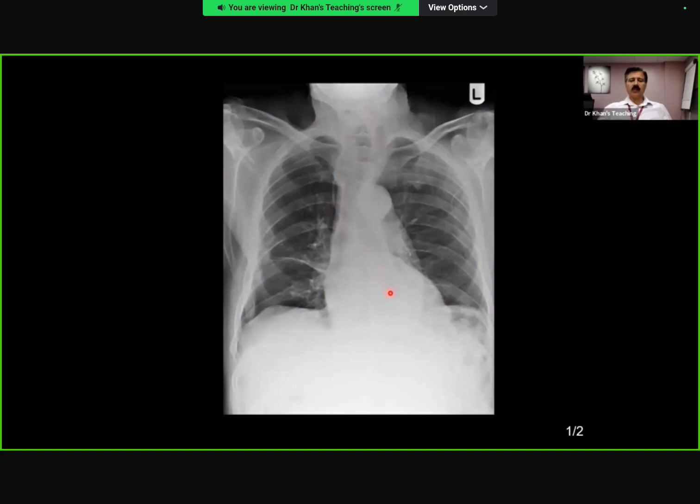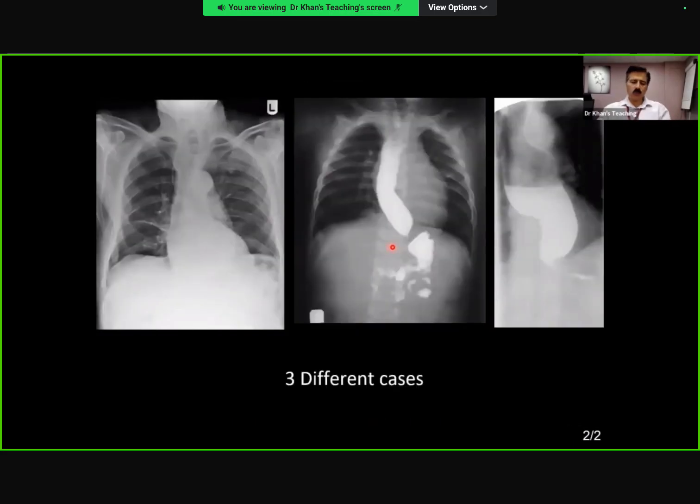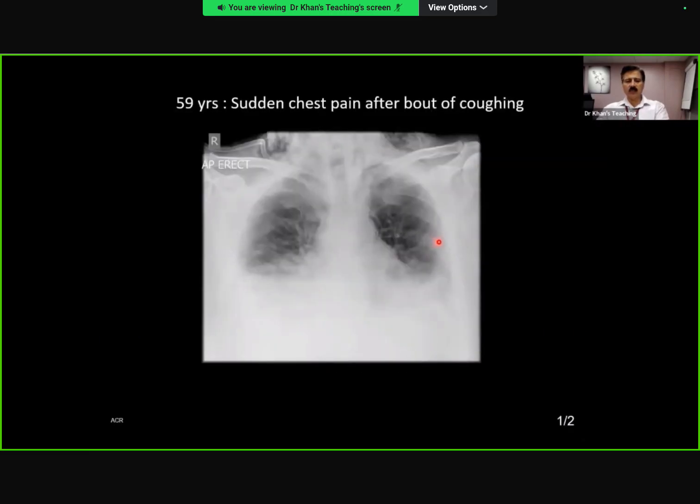Of course, right now we are doing esophagus, and you are so confident about it being achalasia, but in the real world, always keep it in your mind. So well done. Now, the correct answer is yes, you will do a swallow. And these are various examples, this is not the same case, this is a different case. You can see this rat tail appearance here, and then dilatation, achalasia, cardia.